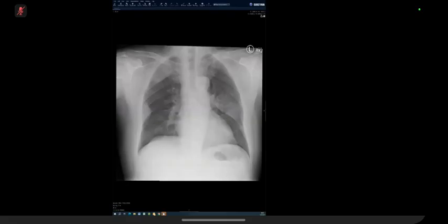I am presented with a frontal radiograph of the chest. There are bilateral opacities with their large margin towards the pleura, particularly in the right upper and lower zone. They have obtuse margins with the pleural edge. In the left mid-zone, although the opacity has an ill-defined border, particularly superiorly, I think it's pleural-based as well, because it has an incomplete or ill-defined margin on one of the sides.